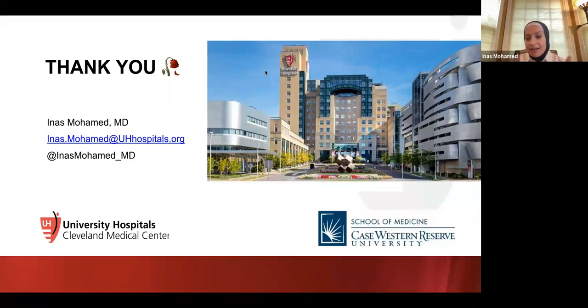You can see a Klatskin tumor like this, an infiltrative neoplasm with intrahepatic biliary dilation, maybe going towards the left, and sometimes you will have both types, like a mass in the liver, intrahepatic and extrahepatic. It's just because our talk today was about hepatic neoplasms, that's why I didn't get into the extrahepatic portion of the cholangio. But yes, of course we can.